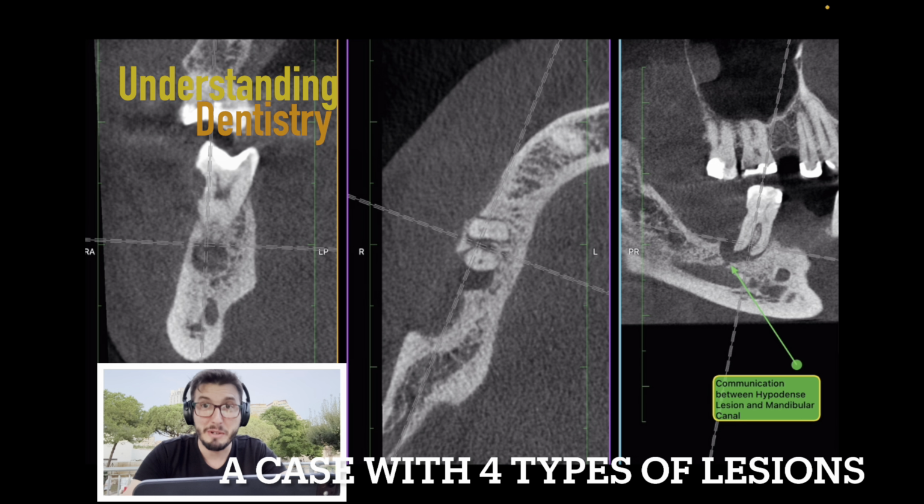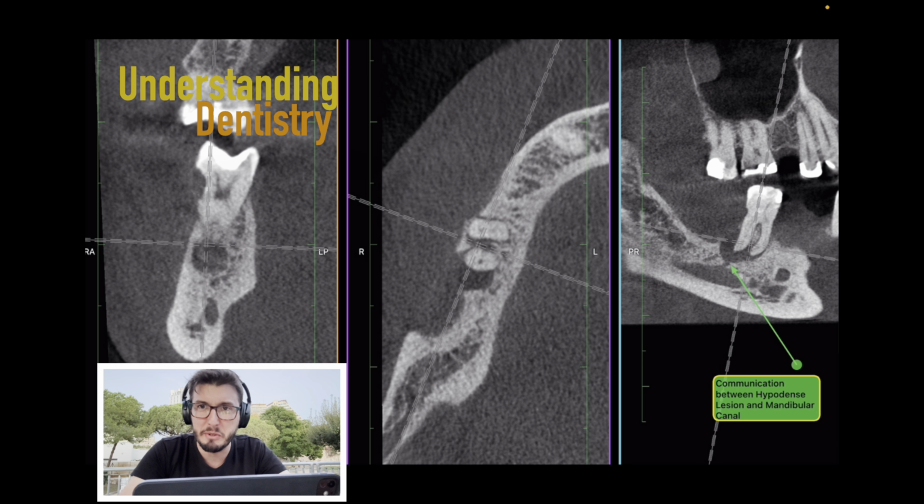Hello guys, and welcome to this video to discuss a case that is very interesting because we have different types of radiolucent lesions. That's very nice for you guys to learn how to diagnose those lesions properly. So without further ado, let's see this case.